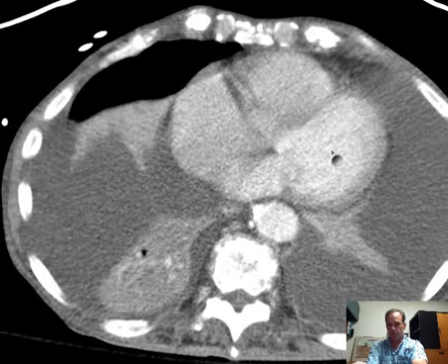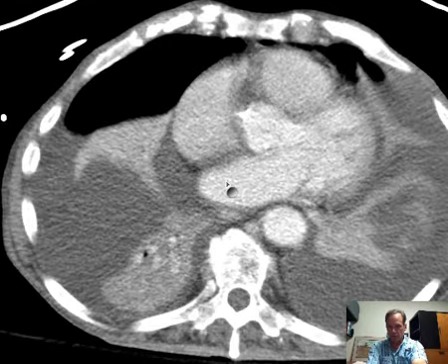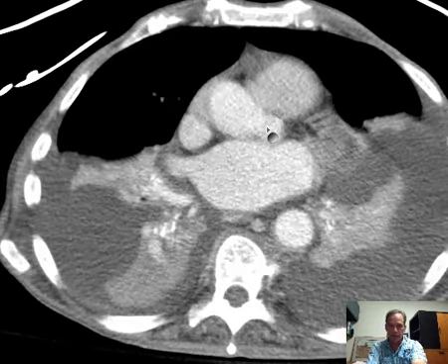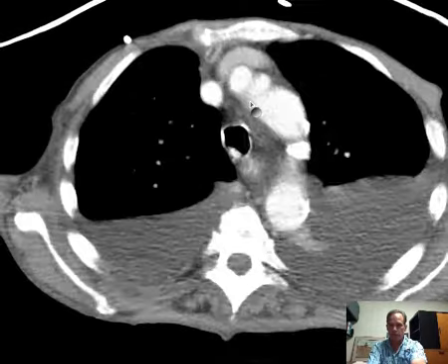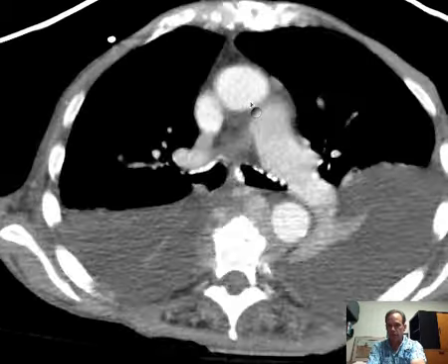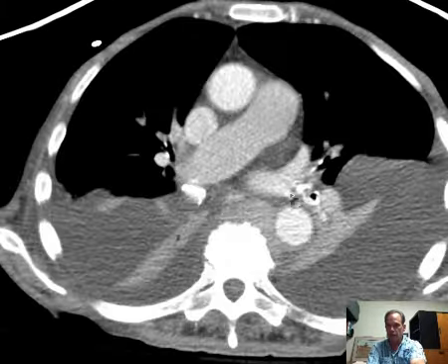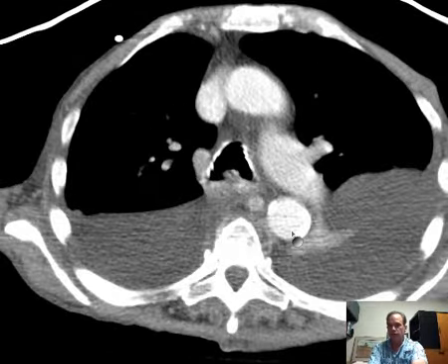You follow up, and you'll see two things. The left atrium empties into the left ventricle, and the left ventricle empties into the aorta, which then continues superiorly as the thoracic aorta, the aortic arch. Of course, this is the ascending aorta, the aortic arch, and then the descending aorta, all of which are components of the thoracic aorta.